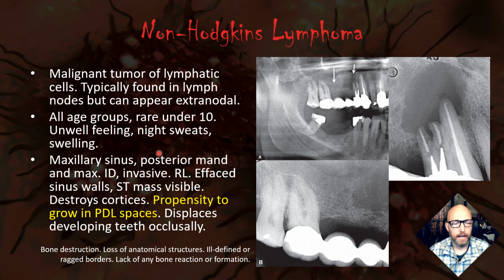This is one that typically occurs in older patients. In the next slide, I'm going to talk a little bit more about age and why it is that we expect lymphoma to just be in older patients, even though there's certain types of lymphoma that younger patients can get.